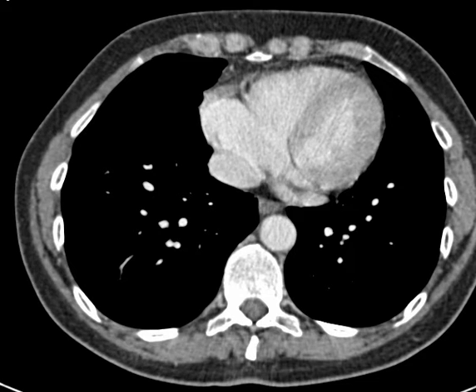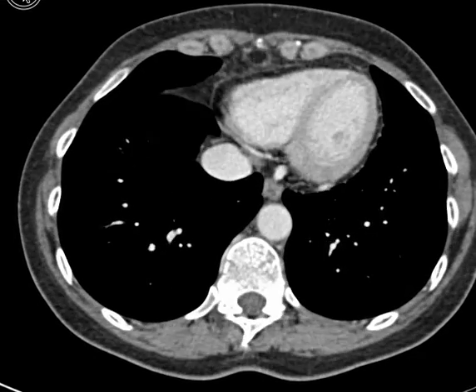So I'm going to start looking at a CT scan that has intravenous contrast on board. It's covering the abdomen and pelvis, and we're going to focus on the gastrointestinal anatomy. So this is the superiormost slice. You can see the esophagus right here behind the heart, or posterior to the heart, and anterior to the thoracic aorta. So here's aorta, and of course for reference, spine. Remember, you're looking from the foot up towards the head of the patient, and that's why the right and left is flipped relative to what you're used to.